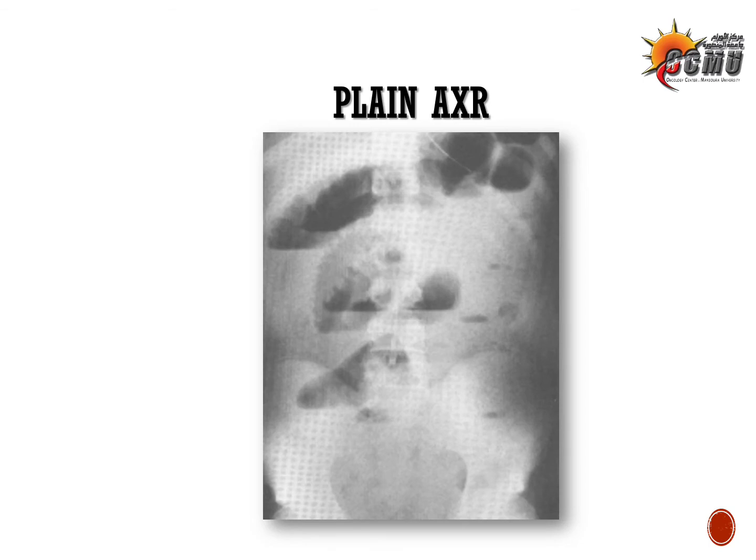As we've mentioned, small bowel obstruction in the abdominal X-ray film presents with different signs, especially in the erect film, the air fluid level. So if you're presented with such a film, you should never say that this film is in the supine position, because you can see air and fluid.